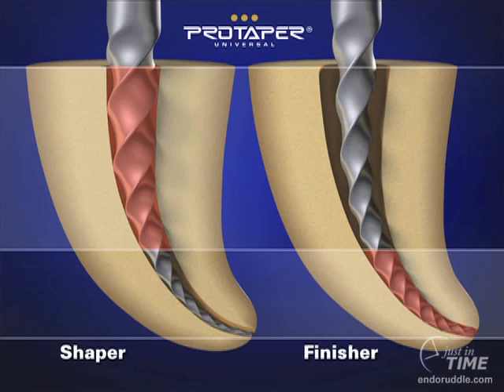When you have a 15 hand file that's loose within any region of the canal, it is not possible for the end of a ProTaper shaper to engage dentin. This pushes the workload up to the bigger, stronger, and more efficient blades. This is the antithesis of how all other files on the planet work, because in crown down techniques, instruments typically lead with their more delicate, smaller, and less efficient blades.